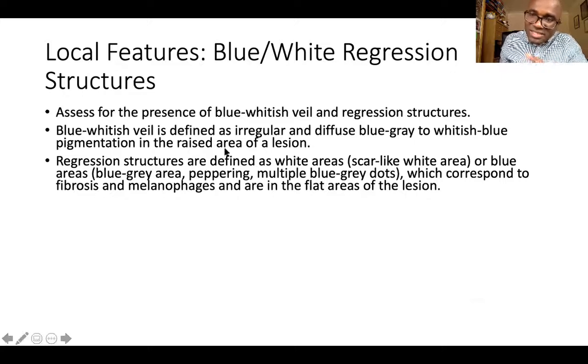Remember that we did mention in one of my videos that blue-gray areas or blue-gray structures can also be seen in BCCs, but they are quite different from melanomas in that the lesion would have initially demonstrated features suggestive of a melanocytic lesion, which will help you to know whether it's a melanoma or a BCC. Sometimes biopsy is what's going to show you, so histology. Anyway, when you see blue, gray, white, it needs to be cut out. If you're not sure whether it's a BCC, 2-week wait, no one will criticize you on that.